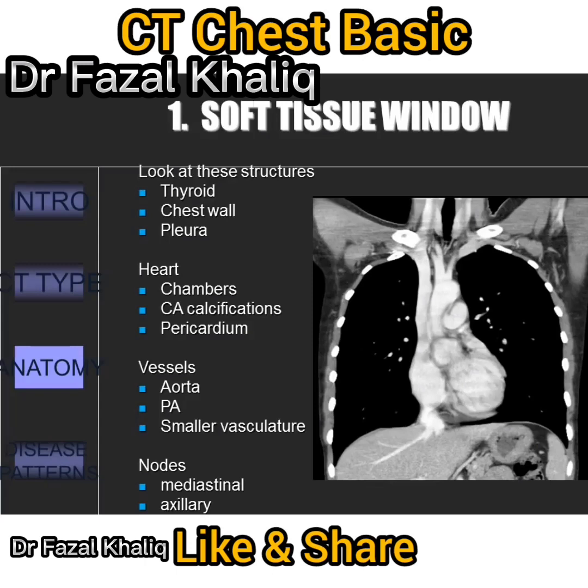The soft tissue windows help evaluate the mediastinal structures, pleural fluid, and calcification. As you can see, aerated lung is black, bone and calcium are white, muscle, heart, and large vessels are light gray, fat is dark gray. It is on this window that you should look for lymph nodes, both axillary and mediastinal. Also, remember to look at the coronal as well as the axial views. It's like a double-check verification mechanism. Use whatever images you can.